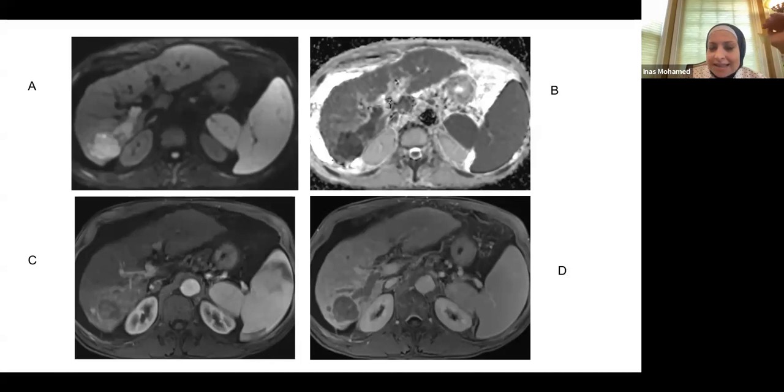Actually, we're going to talk about the LIRADS in a second. You have LIRADS categories like the ones we worry about, 3, 4, 5, right? And you have this separate category, which is tumor in vein. Okay, if you are thinking, that thing actually does not really follow the usual arterial enhancing delayed washout, just the fact that it's a thrombus, and it's a tumor thrombus, it's not a bland thrombus. This is a tumor thrombus. It's restricting just like the tumor it's coming from.